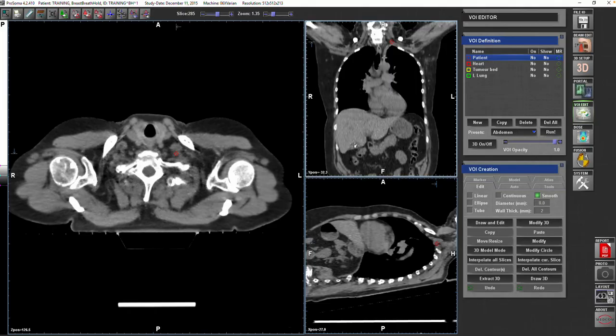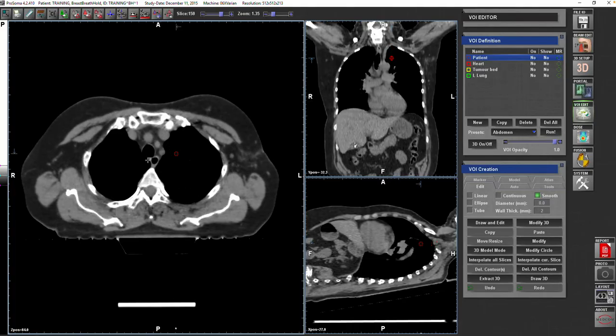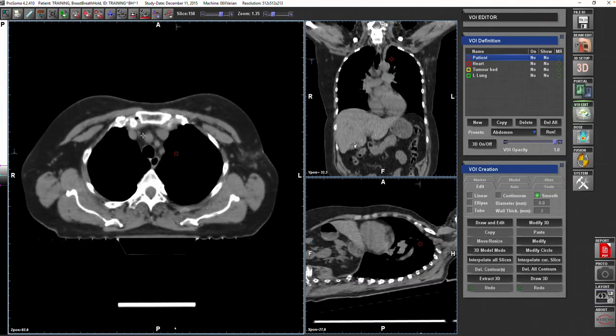So by covering the artery properly, you are covering the vein area in the most cranial part properly. And this is the idea. Covering the artery means that you are covering the vein. So if you take it 5 millimeters above the artery, you're not concerned about the artery, but you're mainly concerned about the vein, so you're covering the vein properly. So this is the first point we were talking about. The subclavian artery and subclavian vein, you need to be aware of it, and you need to understand where it is and how you can look at it.